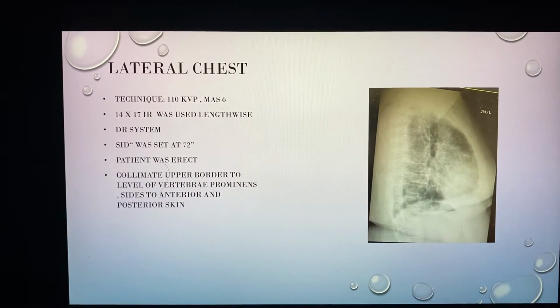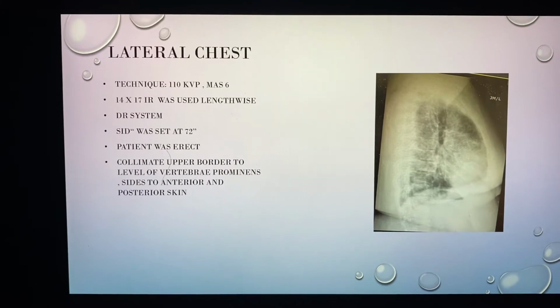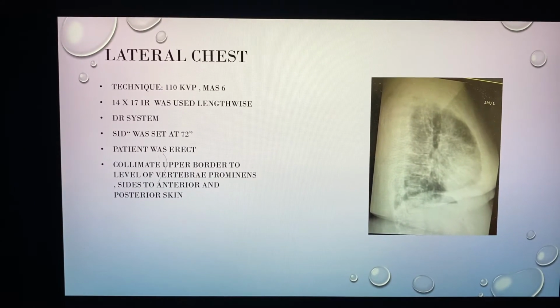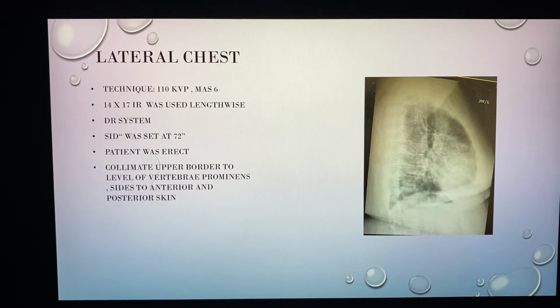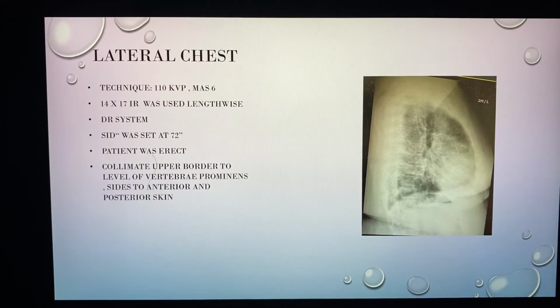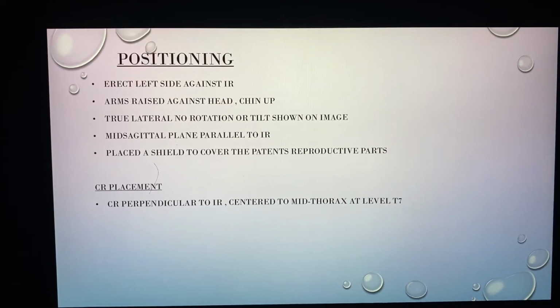This is her lateral view. The technique was the same. Where I was, they didn't really double it, so it was the same thing. 14 by 17 IR lengthwise, DR system. The SID was at 72. Patient was erect, and I was collimating the upper border to the level of the vertebral prominence, side to the anterior and posterior skin.